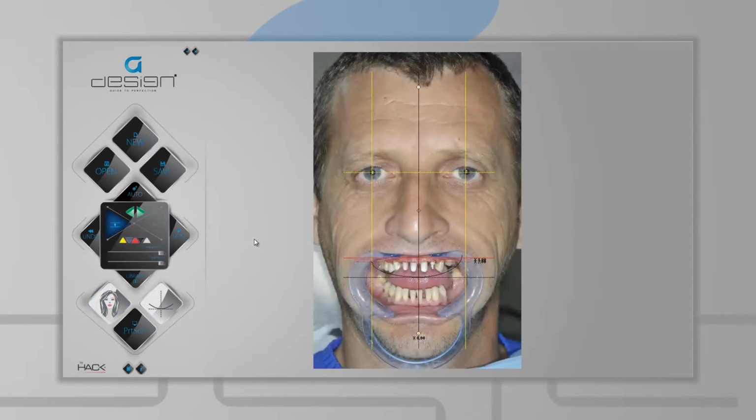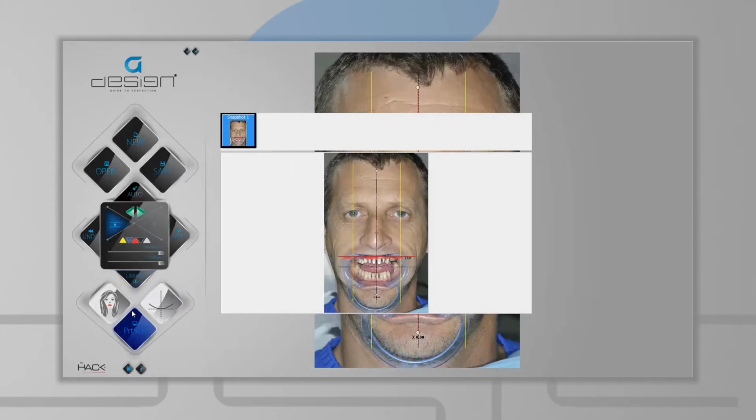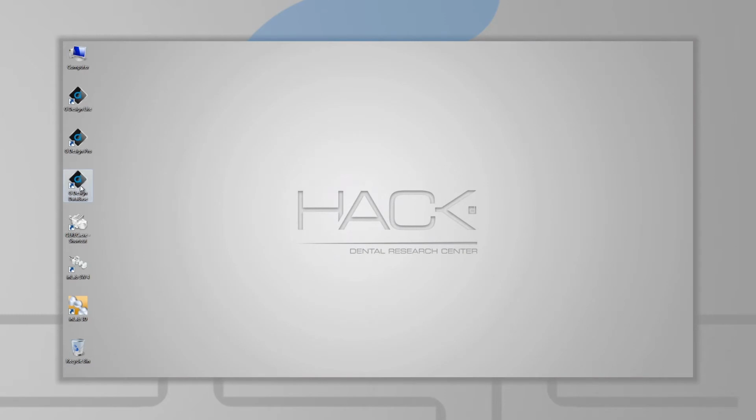For a better visualization and contrast, you can modify the thickness and color of each line, selecting the preferred lines and using the cursors and buttons in the center of the left panel. To finish the process, you can capture the portrait photo and the existing information by pressing Print Screen. You can access previous images by pressing Library or by browsing the application database.